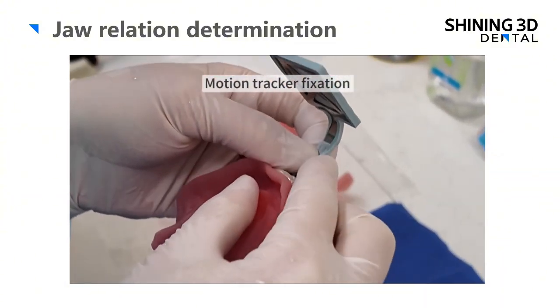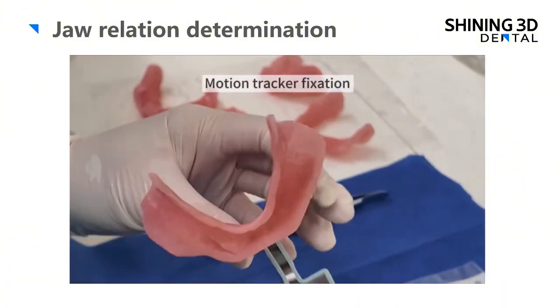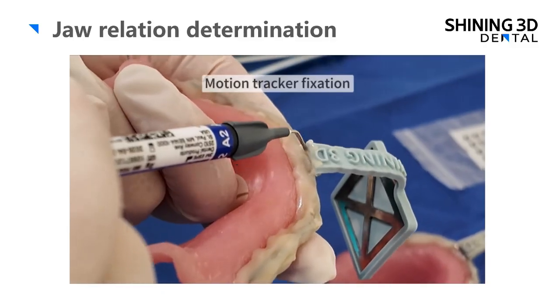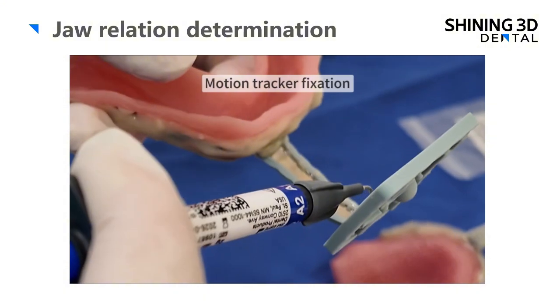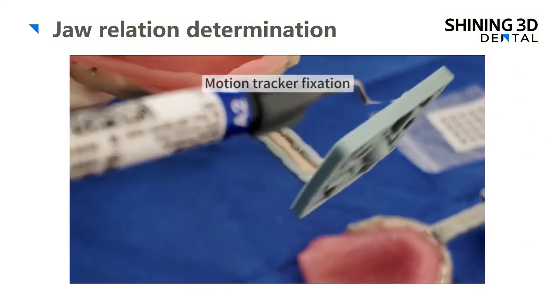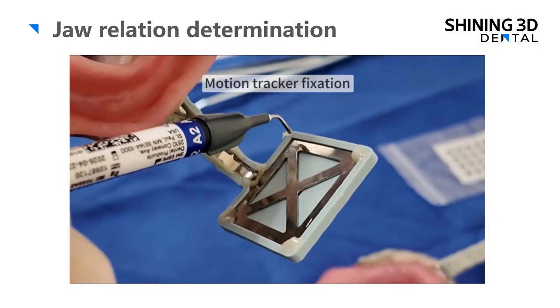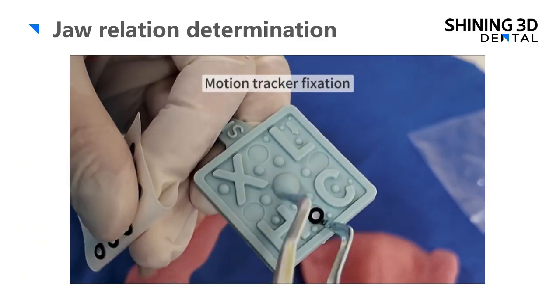Once all the rubber features are fixed, we can use some temporary resin to cement the meeting lines of the rubber feature with the main part of the motion tracker, to make sure the rubber features are stably stuck to the motion trackers in case they might fall off during capturing or tracking movement.